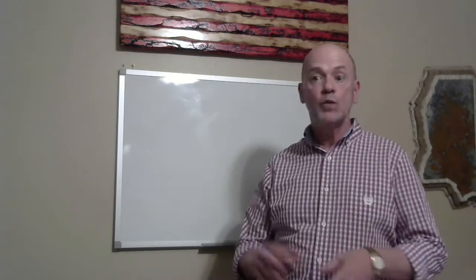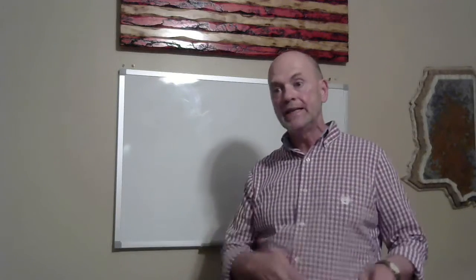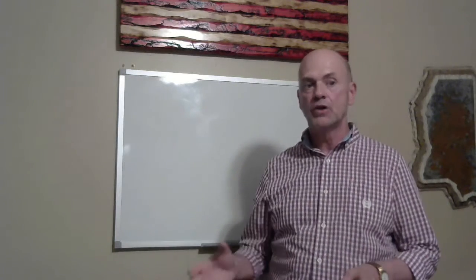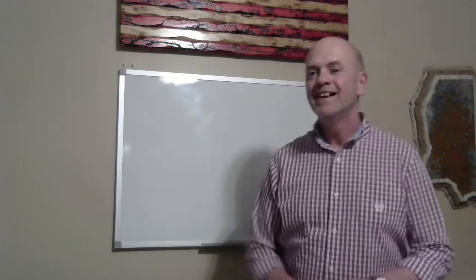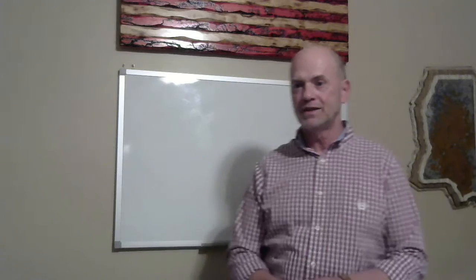Tonight's lecture is ECG waveforms that we can monitor with a cardiac monitor using lead 2 from Einthoven's triangle. Einthoven used PQRST to identify the different waveforms, and he chose those letters because they were in the middle of the alphabet and away from the commonly used X and Y in algebra and whatever they use in geometry.